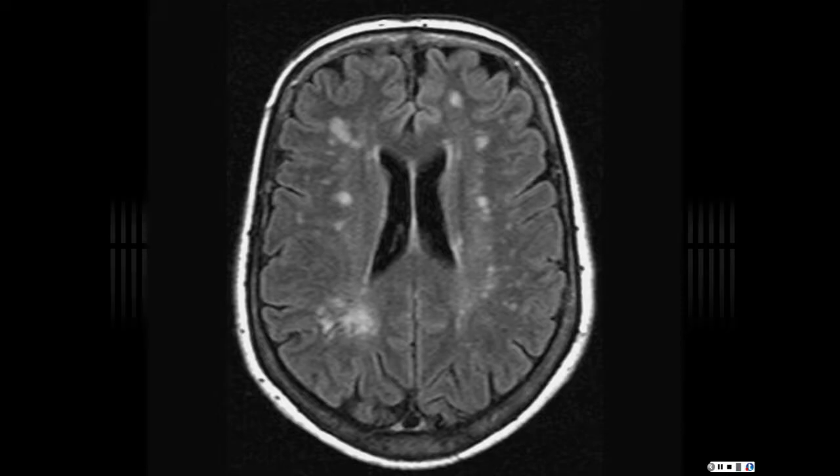If they're 40 and younger, I will say, while this may represent diffuse microvascular ischemic change, other etiologies such as collagen vascular disease, demyelinating disease, migraine, and so on, cannot be excluded. What happens between 40 and 50? It depends on my mood.